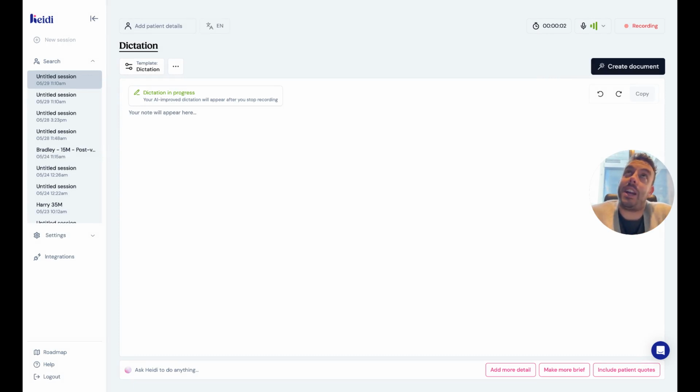Hi, Dr. Chimes, new line. I'd like to refer a patient, Jesse Crichton, to you, full stop. New line. He presented to me today with left ankle pain over 3 months, full stop. He had an injury playing basketball where he had an eversion event stepping on a player's foot, and since then has not been able to weight bear normally on the left foot, full stop. He has not been wearing any brace. He did not do RICE.